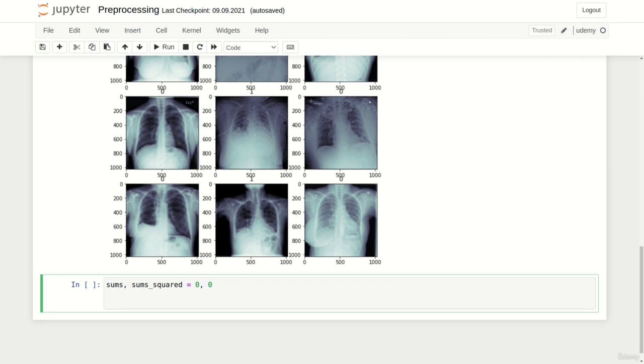Now we can define the loop over all patient IDs. To decide if the current image belongs to the training data or is used as a validation file, we can use the enumerate function. By getting access to the loop counter variable c, we can put all images from X-ray number 24,000 in the validation split. Additionally, let us use tqdm to get a really nice progress bar. The final loop now looks like this.